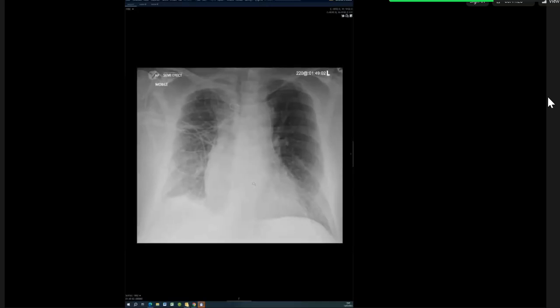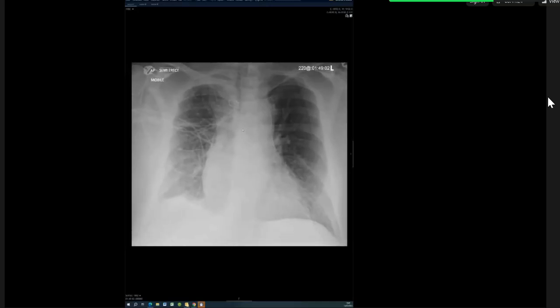So when you start with the chest X-ray, take a few seconds, pause about 5-10 seconds to take in all of it, and then have a little paragraph ready before you start. So this one you see straight away, it's a typical heart failure chest X-ray. When you describe it, start from the lungs, start from the most obvious abnormality, and don't start with the pneumothorax, pneumomediastinum bit, because that may be a thing you do in rapids maybe, but not in a viva description. Don't start with that straight away.